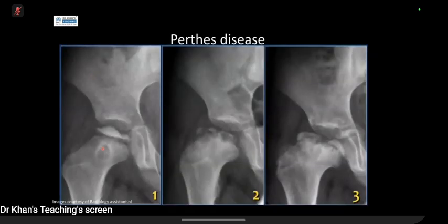What does it tell you? Yeah, so with Perthes, you can also get spontaneous revascularization, so the disease can resolve on its own. As I said, nobody really knows why Perthes happens. In an older person, an adult, if you've got avascular necrosis of the femoral head, you think steroids, alcohol, pregnancy, stuff like that. But in kids, it's really idiopathic, nobody knows. Disruption or alteration of the blood supply, probably. And so here we see in the first stage, you get this collapse and sclerosis, like what we saw with the metaphyseal lucency. These pictures are from Radiology Assistant, which demonstrates it nicely. And then you've got progression to fragmentation and development of a very short, broad neck, the coxa brevis, if I'm not wrong.